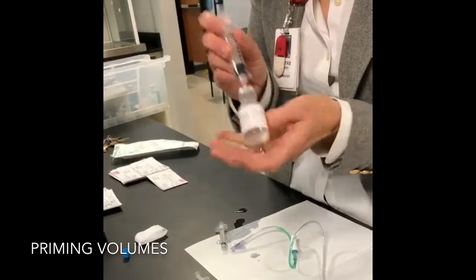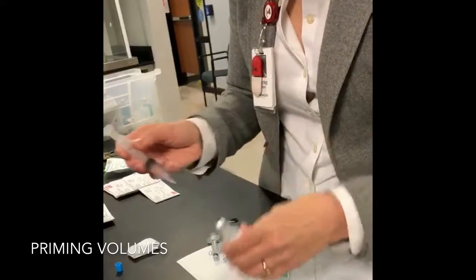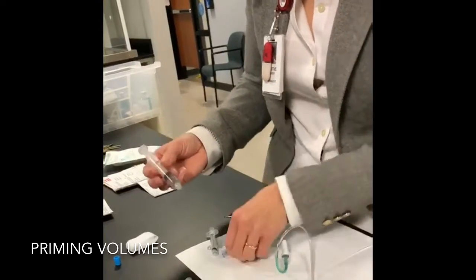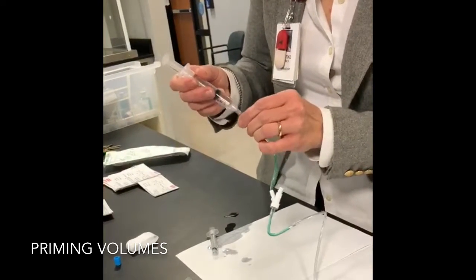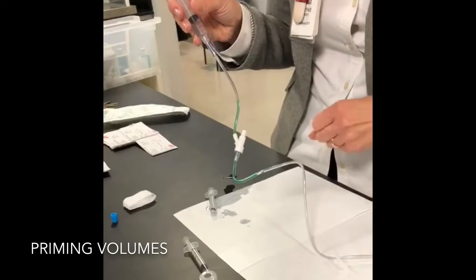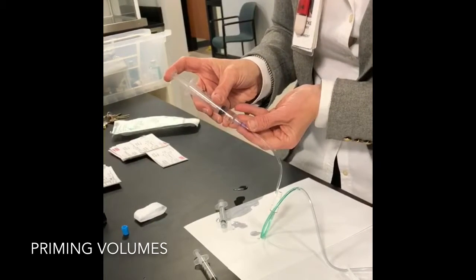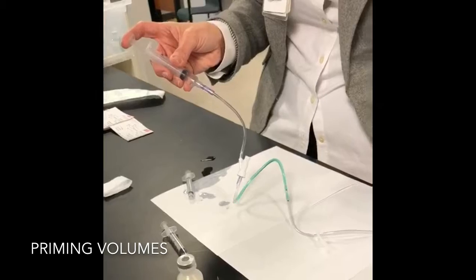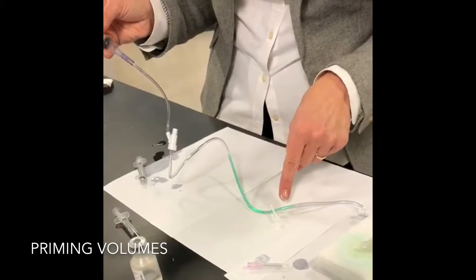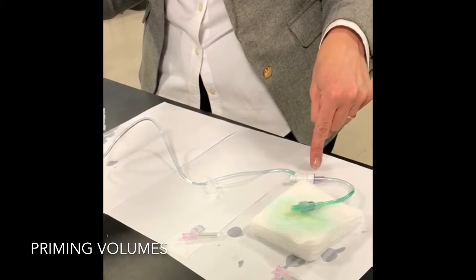Usually a saline flush is typically what they would use, but you would attach, and in order to flush this through, you would need 5.5 mils because that's the volume there. And so you would have to attach your flush, sort of like a chaser, I guess you could call it. But then you can see as I'm flushing this through, the drug that was sitting in that tubing is going to finally go through and reach the patient.